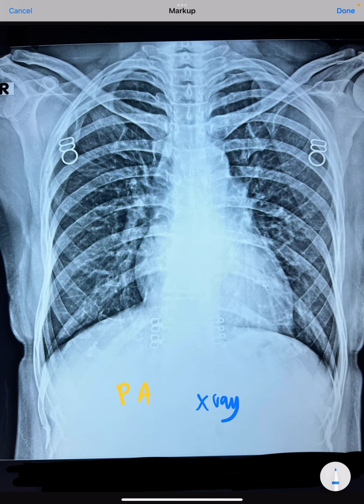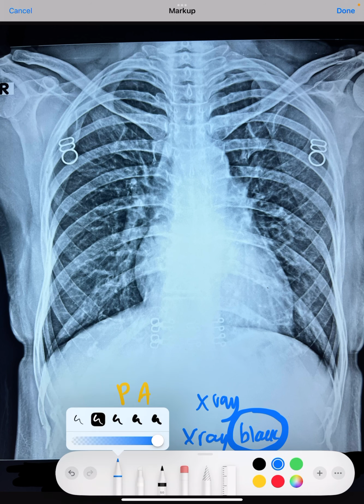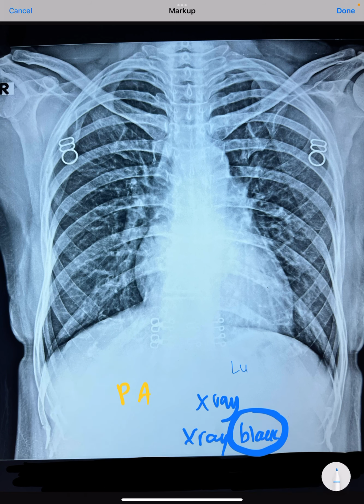Now we know that X-rays are inherently black in color, so we cannot see them. They are black. So whenever lung parenchyma is intact, lung is all filled with air. So X-rays can pass very easily. That is the reason why lungs will be seen as a radiolucent structure. So we must know that this all portion is of lungs. That is the reason why you can see the radiolucency over here. So this is all radiolucency of the lungs.